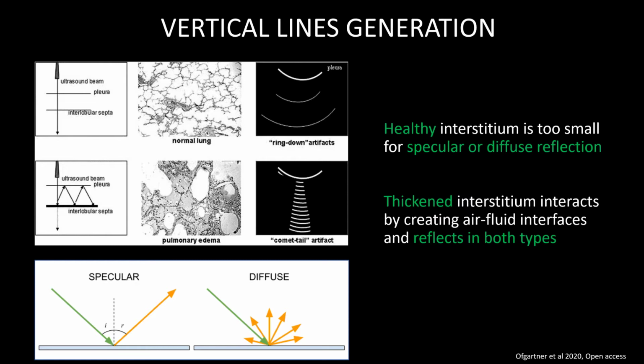In essence, the concept at play is that ultrasound waves are generally reflected by structures in a specular pattern, as in an organized fashion. Part of them are directly reflected at a transducer and interpreted. Some surfaces produce a more diffuse pattern or scatter, as the tissue is too small to have an organized reflection towards its transducer and produce a well-defined image.